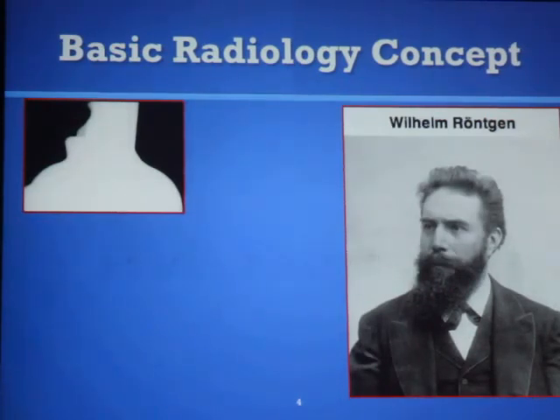But if you look at that screen, it does not make any sense to us because it's only one type of object exposed there, and it just doesn't tell us anything that it was of that shape.